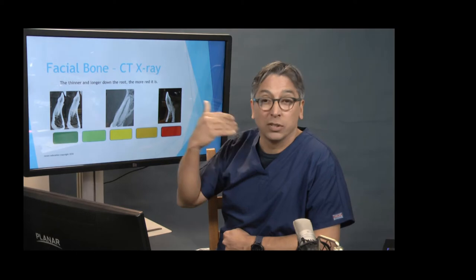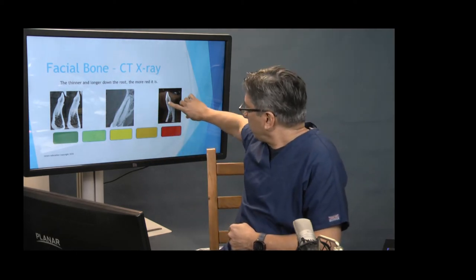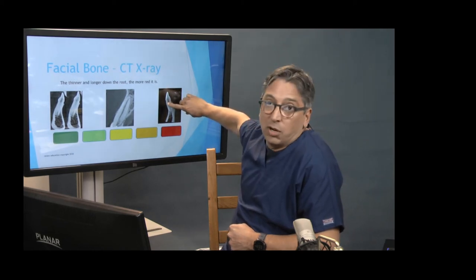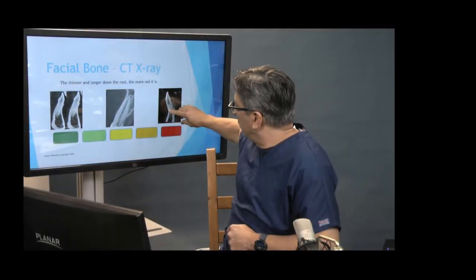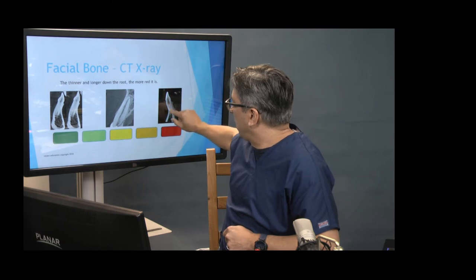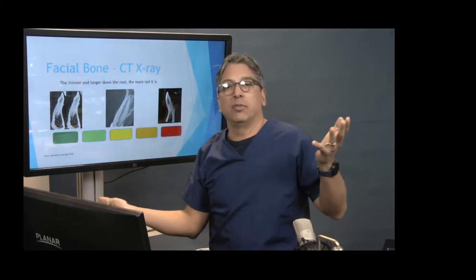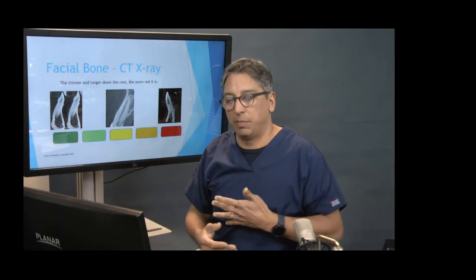Obviously, we want it to look like a natural tooth coming out of the gums. And then here on the front, this side is the facial side, you have virtually no bone at all the way down. So it's not just coming from here to here, it actually looks like it ends right about there. So most of the tooth does not have any sort of plate whatsoever. So we don't really like that at all, because when you take that tooth out, you don't have any bone to graft to or try to get reinvigorated to grow bone back into that site.